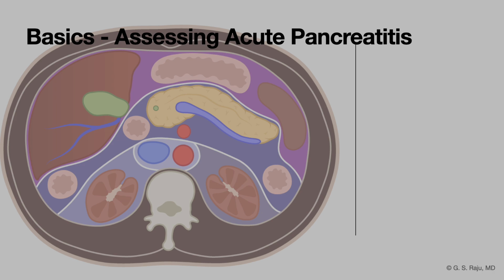When you look at acute pancreatitis, pancreatic injury, think about, is this limited to just the pancreas, or is it extending into the peripancreatic tissue?